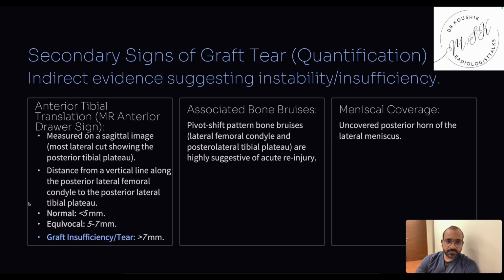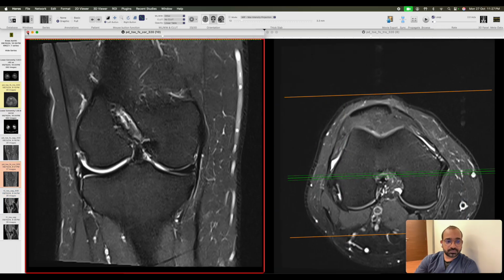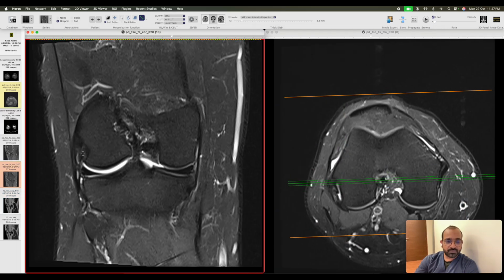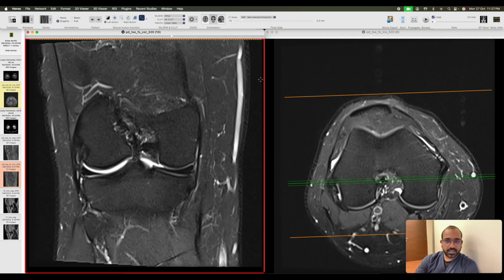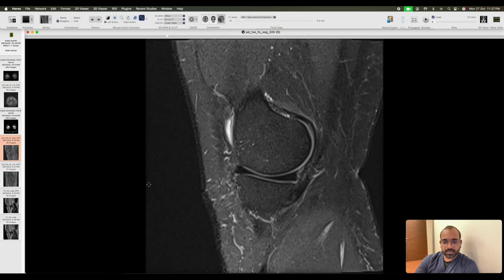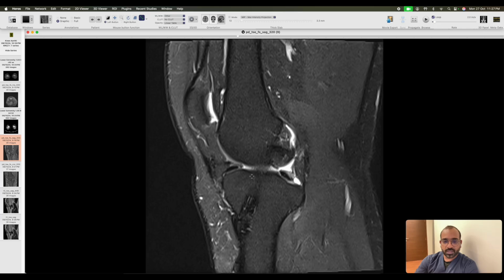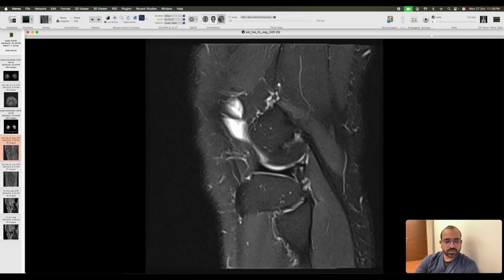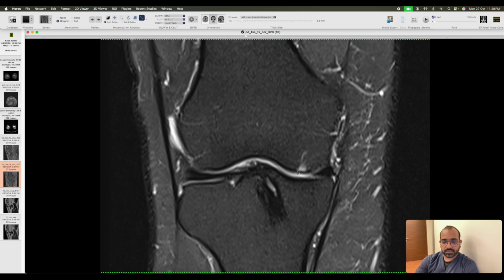So if we see just now what we have seen, in this case our tibial tunnel is okay, femoral tunnel is okay. But is there any abnormality? In this MRI, there is marrow edema in the medial femoral condyle. That looks more like an osteochondral injury. You can see this is an osteochondral injury, with a breach in the cortex and cartilage here.